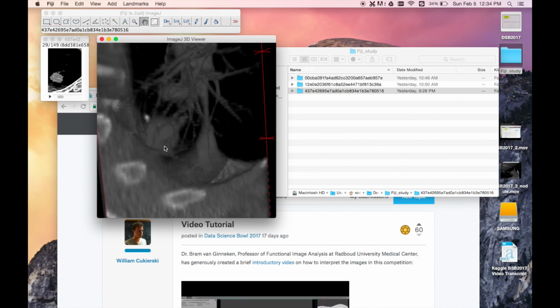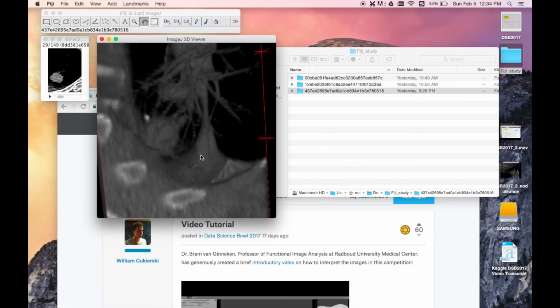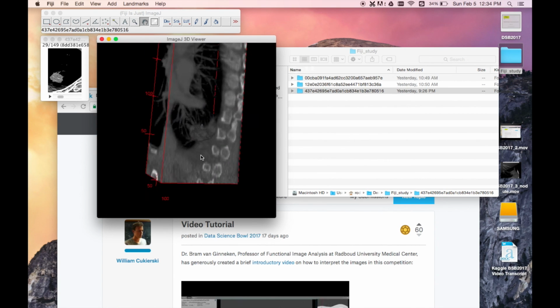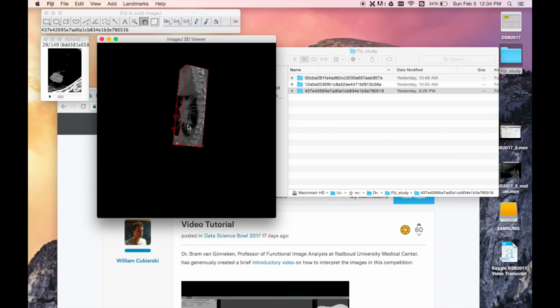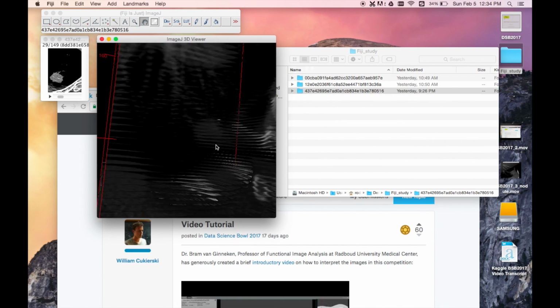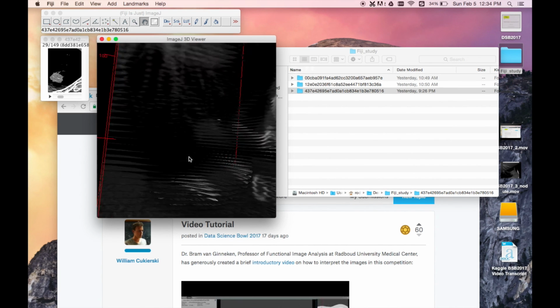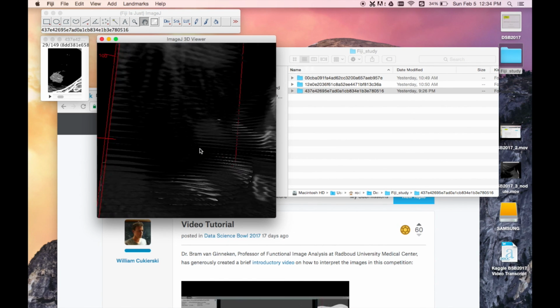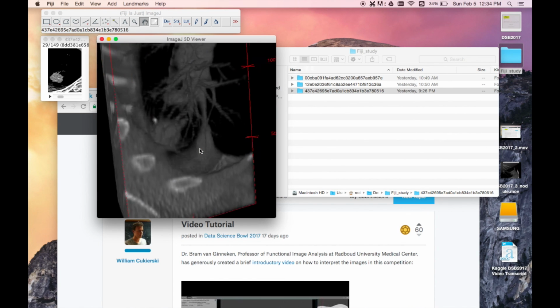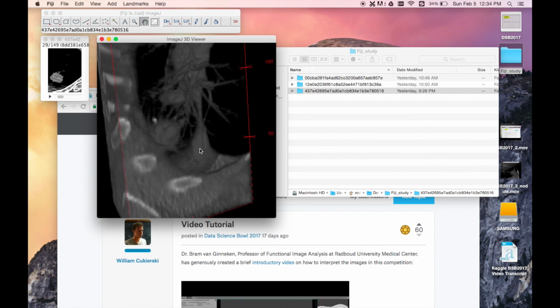You can further zoom in and then scroll in the other direction to zoom out to view the whole structure. So I hope this 3D visualization can give you some insights when you are designing the features for machine learning or other algorithms.